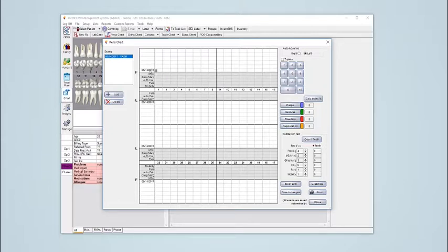The white area has 6 rows, and each row will designate and relate to an examination session or an examination date. Now the date is here, and then we have other functions beneath it. The white area is used for the probing readings.